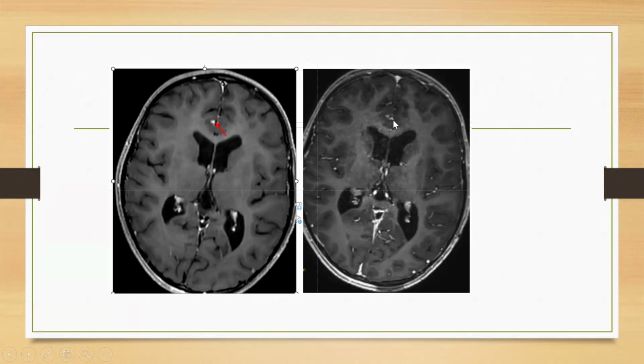This is one of the cases of metastasis. In metastasis, you are able to see the nodules separately in spin echo. Whereas in this SPGR gradient type of imaging, we usually will miss them because they appear similar to the vessels. When the nodules are fewer than 4, only the nodules can be irradiated. When there are more than 4, whole brain RT has to be given, and treatment management will be different.